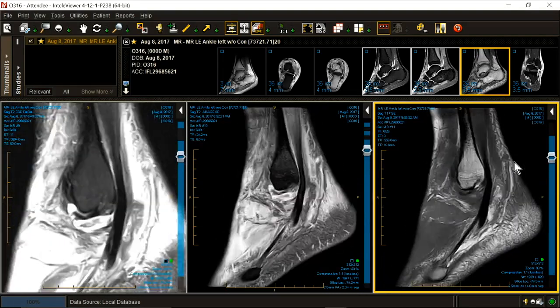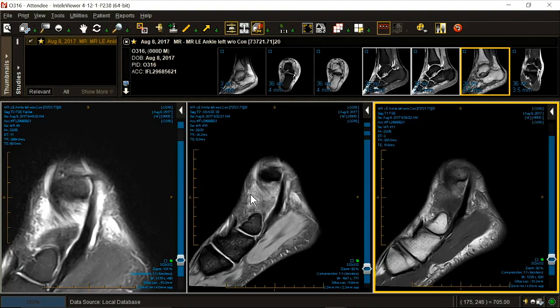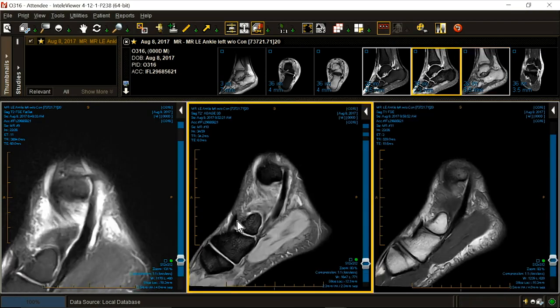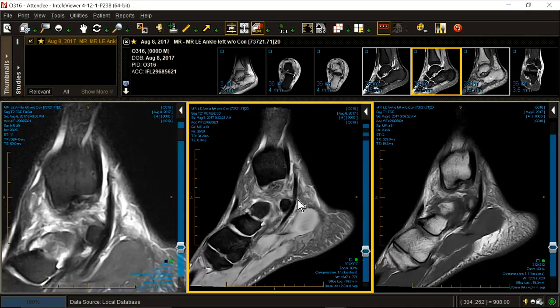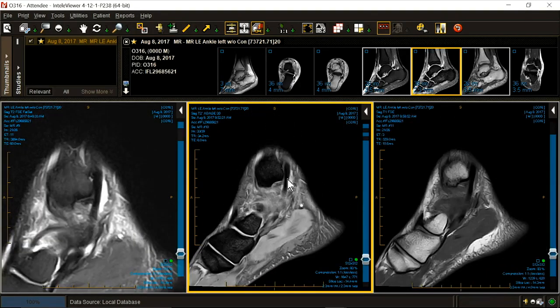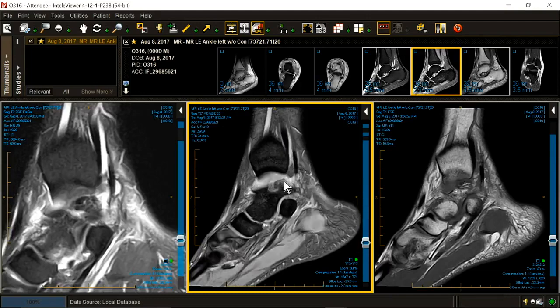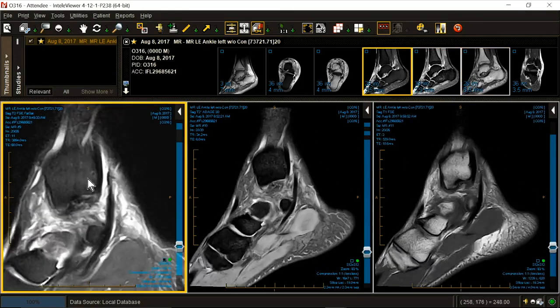Compartment 3, Tom, Dick, and Harry. There's Tom. Lots of swelling in front of Tom. There are fibers of the deltoid. Where's Dick? Here's Dick. And there's Harry right there. That's Harry. I picked it up a little asymmetrically there. It's kind of volume averaged with the PT.